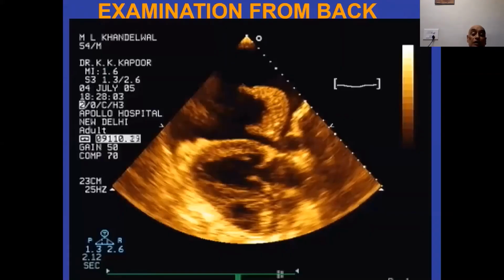And just before we end, we've got a couple of views. One is the view from the back. Normally, if you put the transducer at the back, you hardly see anything. If you are good at lung ultrasound for lung water, you can see the curly lines. But besides that, you hardly see anything because the lungs are inflated, and air is a bad medium for ultrasound transmission. But once you get an acoustic access, and that acoustic access is because of pleural effusion, so when you get a left or right pleural effusion, you can visualize from the back.